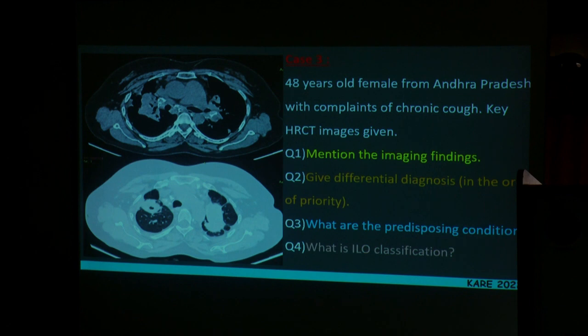Irregular bilateral upper lobe soft tissue mass, right? Then what is this? With surrounding emphysema. These masses are due to silica deposition, and these emphysema changes are called focal dust emphysema. Now what are the differential diagnoses? No need of differential diagnosis, you can straight away give the diagnosis. It is progressive massive fibrosis due to silicosis.